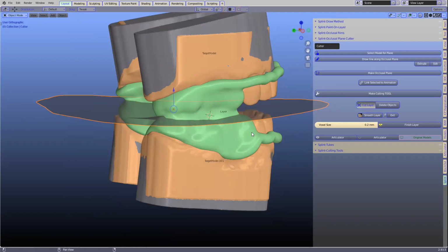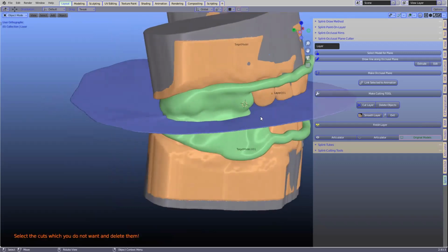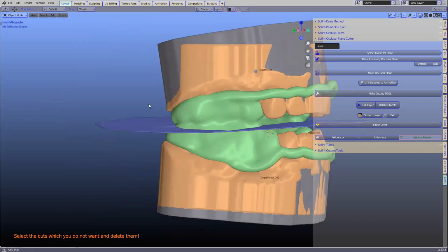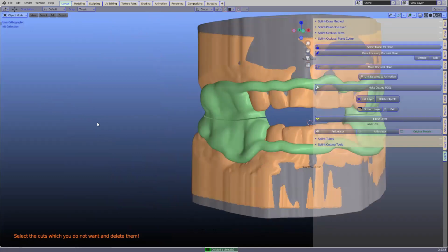Then that'll turn blue, and for good reason, because we can use this for orthodontics to hold brackets. So if you want to view other videos, go here in the videos. There's a video there showing how we use this cutter to hold orthodontic brackets, which is absolutely amazing how that works. X delete, okay? So we've got our cut.